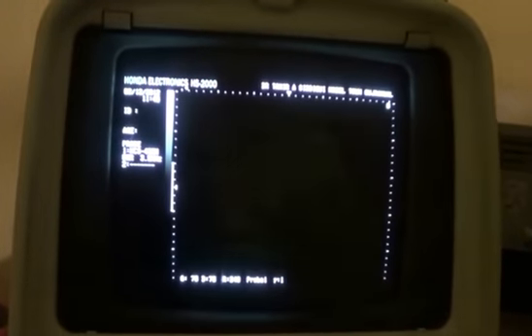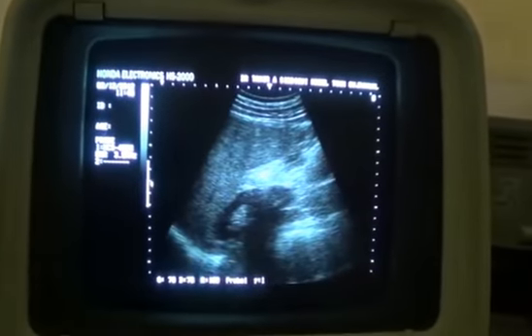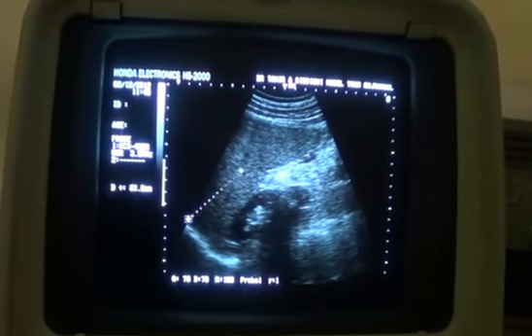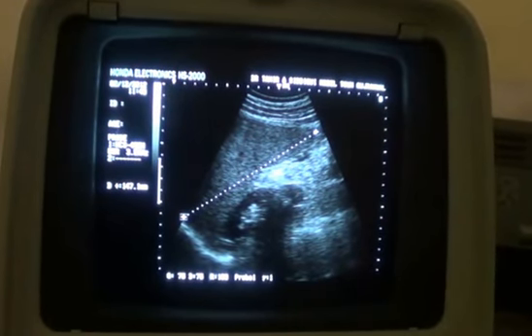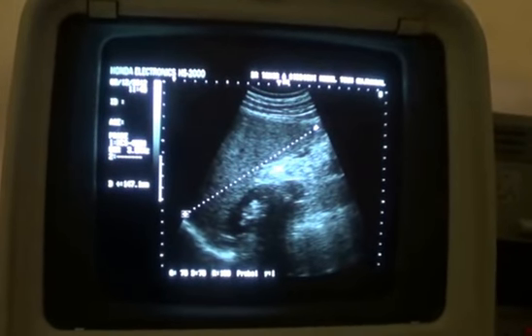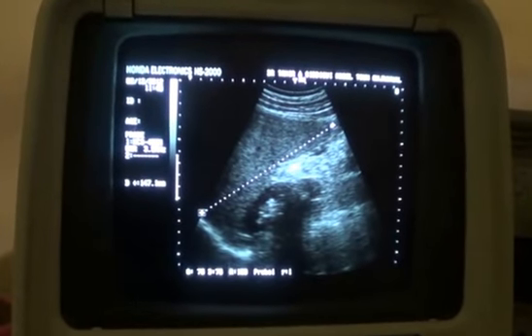If we try to measure as per the routine that is being used, then it measures 14.7. Now, between 12 to 16 centimeters is considered normal. So if we use this technique, which is in practice, then the liver span is 14.7, thereby suggesting that the liver is within normal limits. The liver span is normal, whereas it is not.